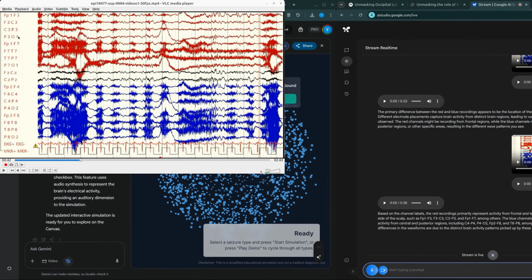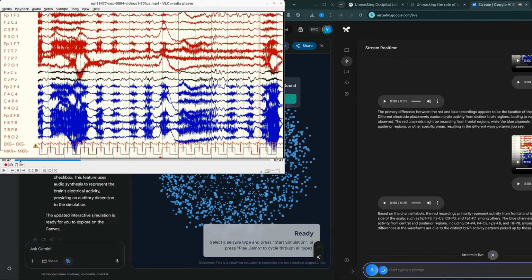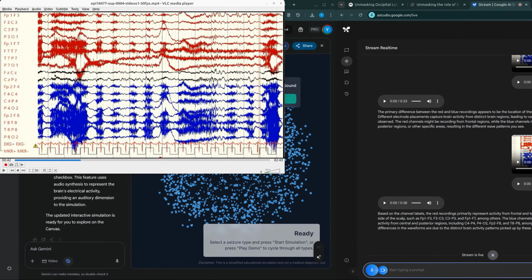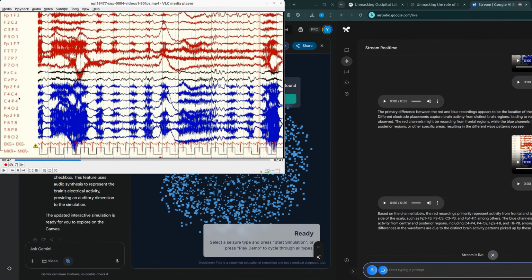Okay, that's very nice. Again, looking at the labels of each channel, what's the current montage that is being used? Can you explain what it is and make a guess which montage is being used?